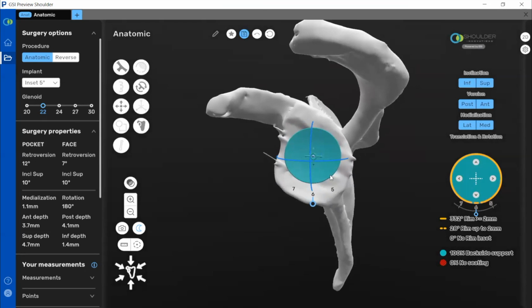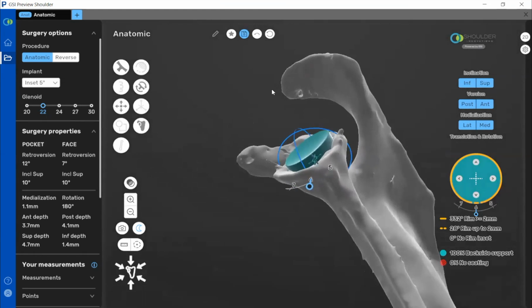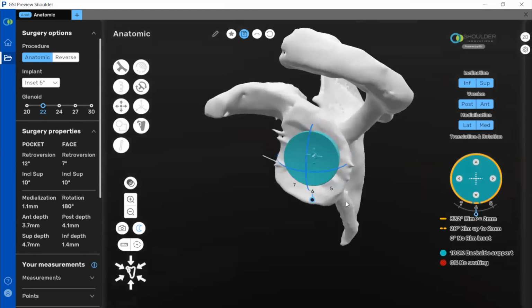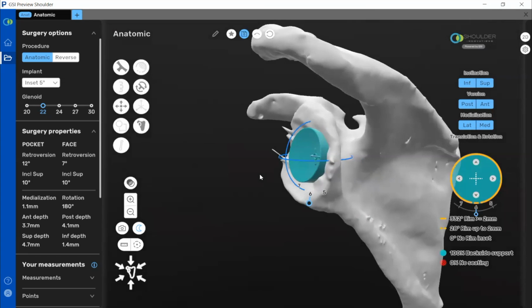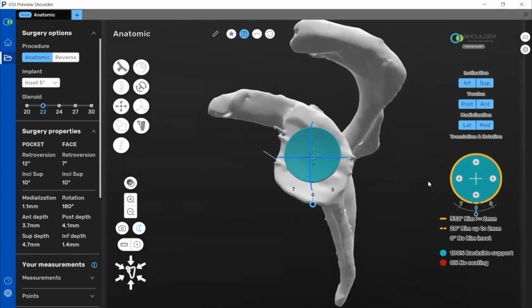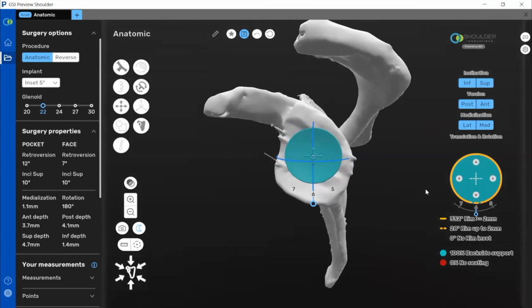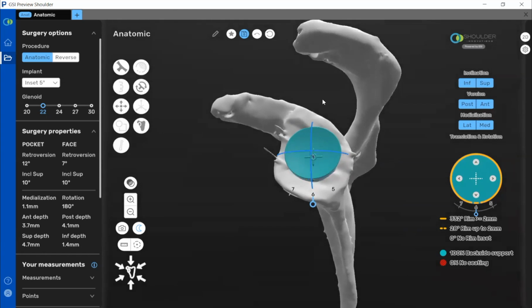So this makes it very easy to plan. So I know that I can go in and do this case. I don't have to do any kind of off-axis reaming or reaming that's not perfectly parallel to the surface. I can basically put it right down against the surface, and I know when I correct it, it'll end up like right here on the left in the middle at 7 degrees, which is perfectly acceptable.